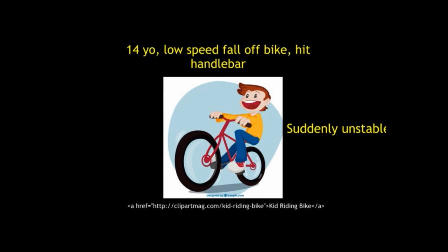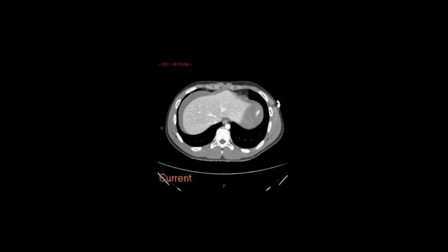Last patient that we're going to look at. So this little boy had a kind of innocuous injury when he fell over his handlebars, and I'll show you his CT. So here we are, and I'm not going to give you any commentary about what we see, because this is your last question.